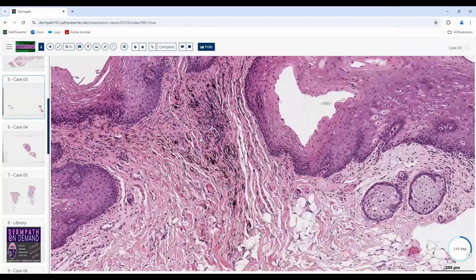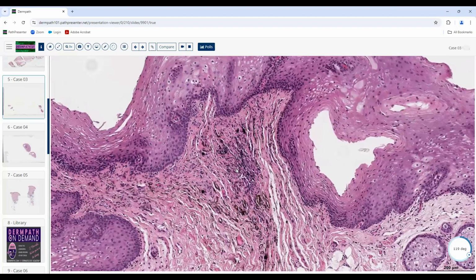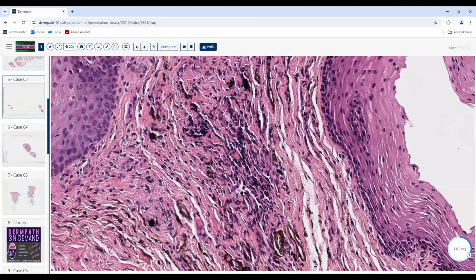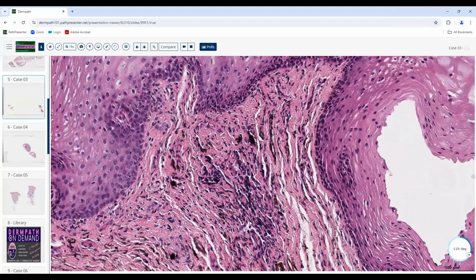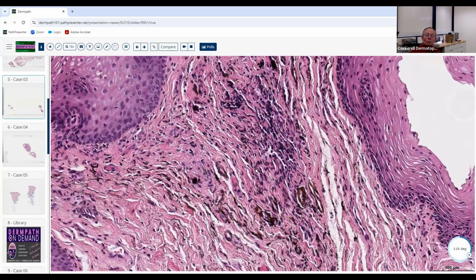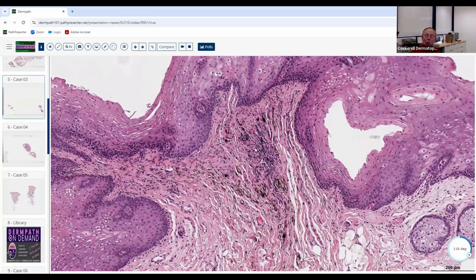And then going in a little bit closer, I was trying to see if there are any underlying melanocytes or histiocytes that the pigment was surrounding, but I didn't really appreciate any cells like that. Mostly it just seemed to be intermixed with the collagen. Okay, good. So you're looking at a dark material.